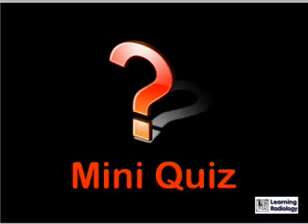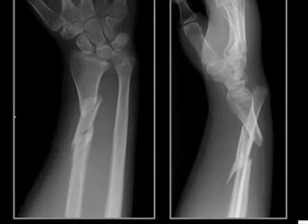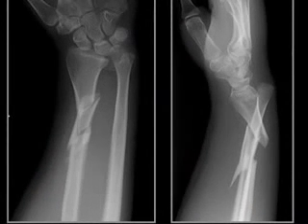Now it's time for the mini quiz. You can turn your computer or MP3 player off as you consider which type of fracture of the forearm you're looking at here.